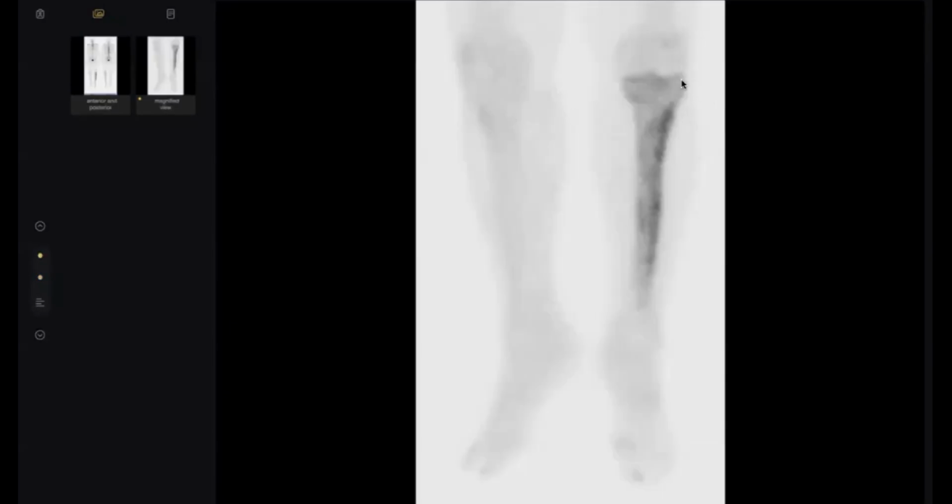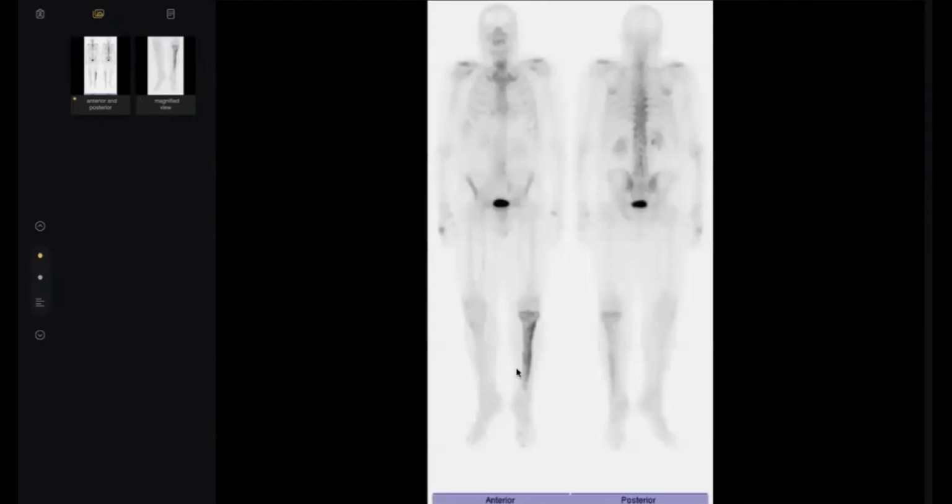My colleague, this is a tibia. This is not a localized tibial pathology. Almost most of the tibia and the cortex are involved. By the way, when you see something like this in any limb, put Paget until proof otherwise, and correlate with X-ray. This is degenerative. I think there are many degenerative changes, especially in old age.